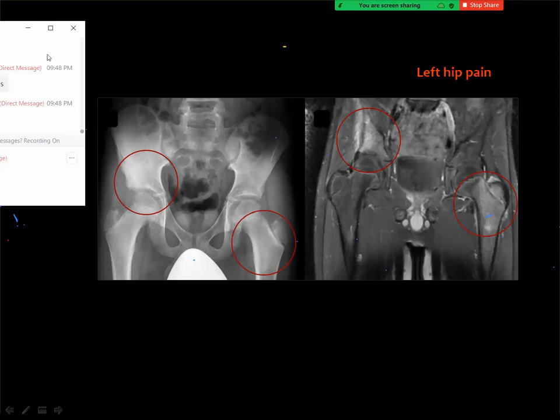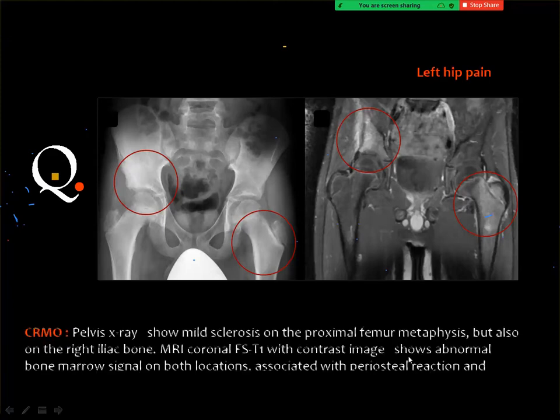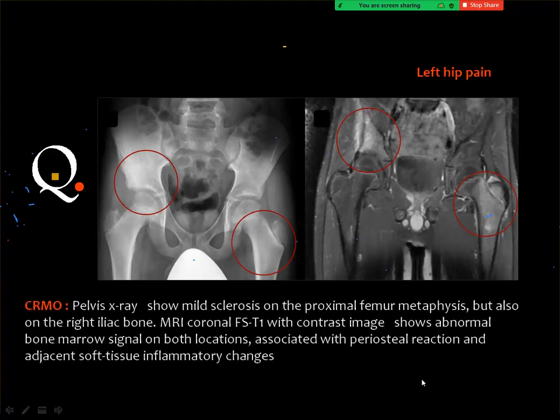Yes, and this is chronic recurrent multifocal osteomyelitis, as I have mentioned before, and I said that this lesion is frequently seen in clinical practice, and then you should remember this possibility. You got a young person with multiple areas of bone marrow edema, no history of trauma, and no significant signs of infection. Then one of the classic histories, whenever you hear it, is the recurrence. This is a recurrent disease.